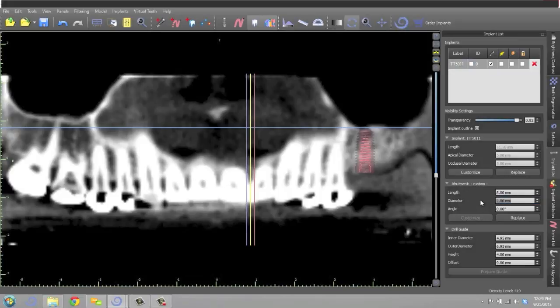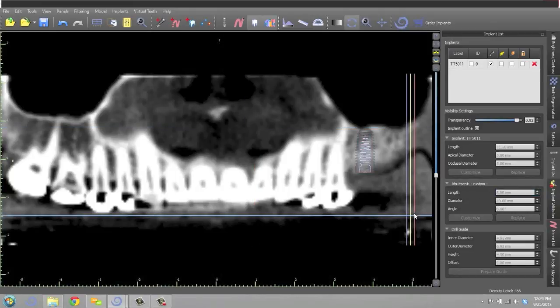And I'm going to put on a 10 millimeter abutment, and the abutment's going to be 8 millimeters high. I want to simulate the future tooth, so the molar is going to be a 10 millimeter molar. And again, this is an infinite adjustment. So if it's a small molar, say a 9 millimeter, or a large molar, 11 millimeters, you dial in what you want. The point is that the implant will be centered in that abutment no matter what size it is.